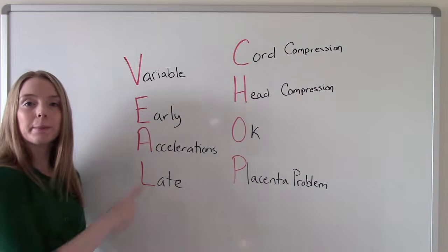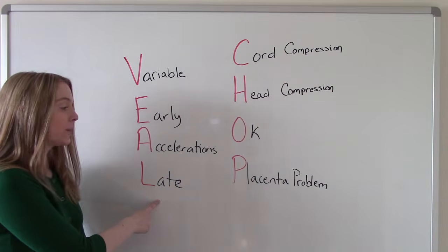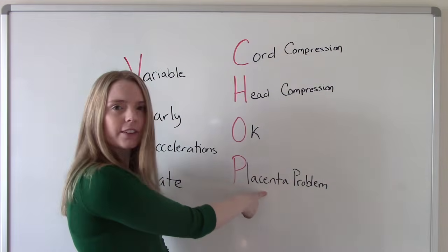Accelerations, we like those. That means baby's moving around. We're not worried about those at all. So those are okay. And then late decelerations are usually caused by placental problems. So something's going on with the placenta. It's not working very well.